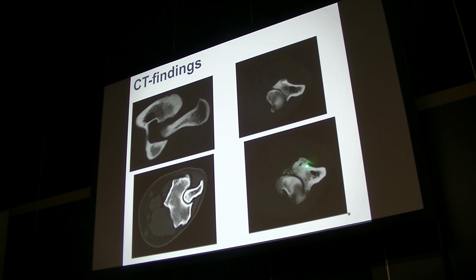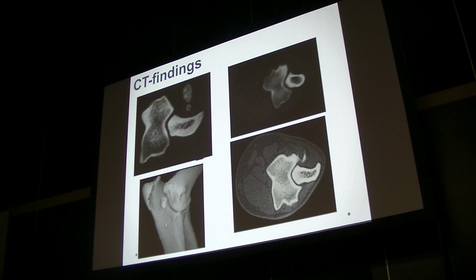several fragments at the level of the medial coronoid process, displaced fragments. It's really a very inhomogeneous aspect, also an osteophyte here at the medial side of the ulna, and in this case just a small osteophyte on top of the coronoid process. So probably this can be called a primary lesion, primary flexor enthesopathy, and this in combination a concomitant flexor enthesopathy. And then it's still often difficult in these cases to know for sure where the lameness is coming from.